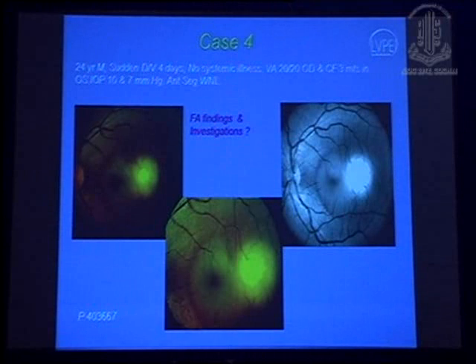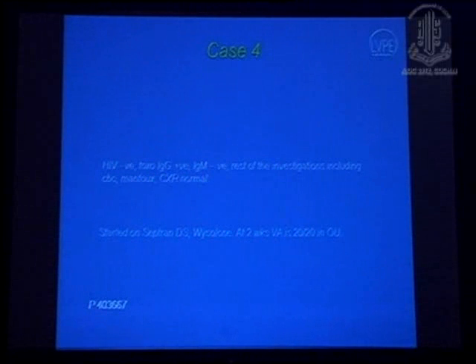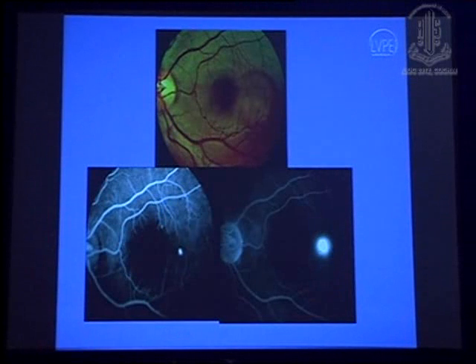Now this lesion, what is this? Again, you can answer. Ajit, this is the last slide, I think. Okay. So this is again a choroiditis kind, but the etiology is different. It looks like a tubercle granuloma. Choroidal granuloma. Etiology is toxo, and treatment was started and it has healed. And a similar lesion, but this is CSCR. So at certain times, unless you give great detail to the patient examination, you may miss lesions.